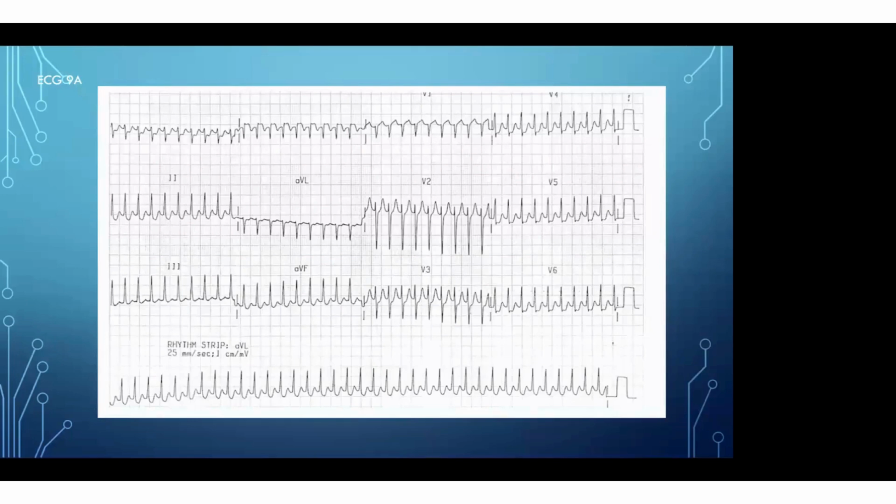Can anyone tell about this ECG diagnosis? SVT. SVT. SVT. Can you read the ECG? Is it a wide complex? What is the heart rate? Is it within the physiological limit? Narrow complex, a narrow QRS. And the heart rate is around? Some 210, 220, something like that.